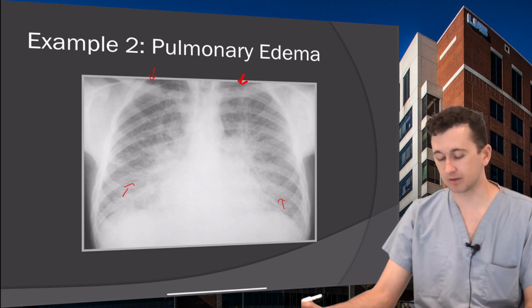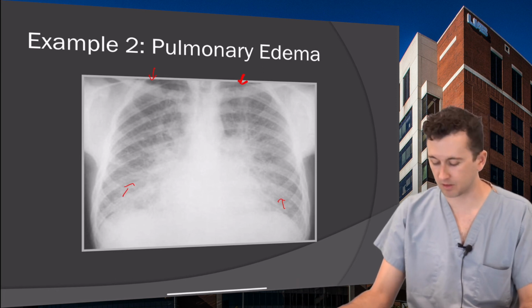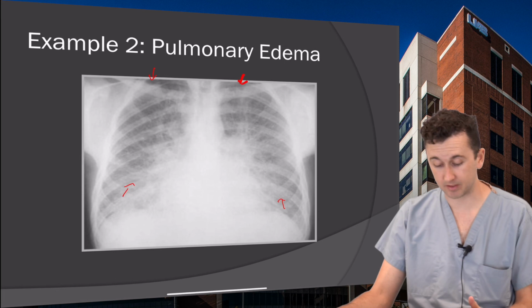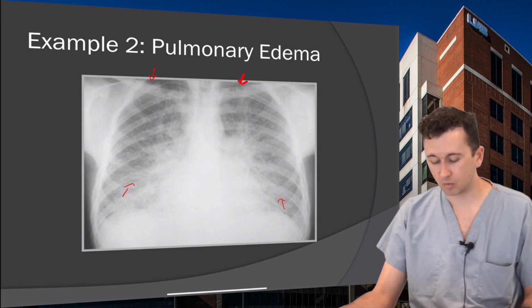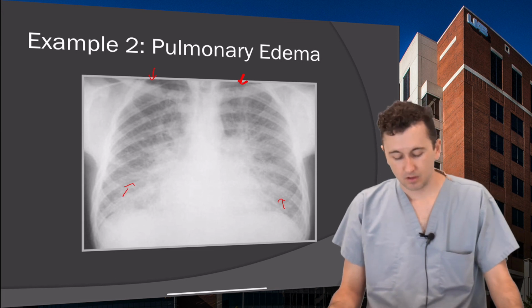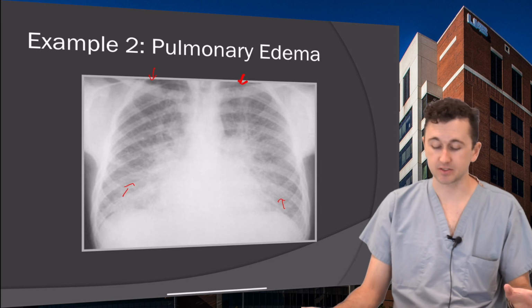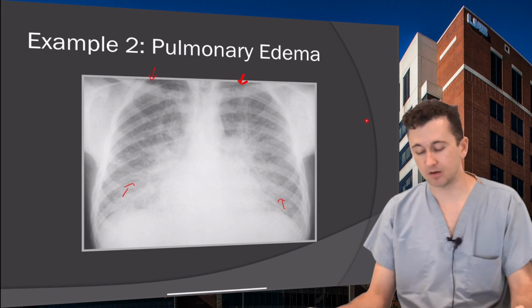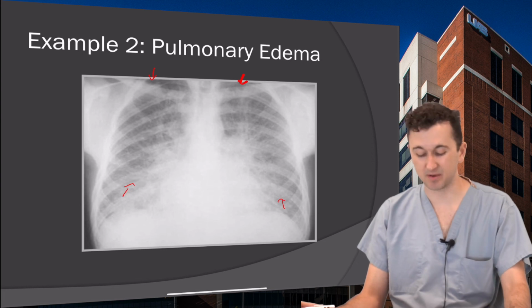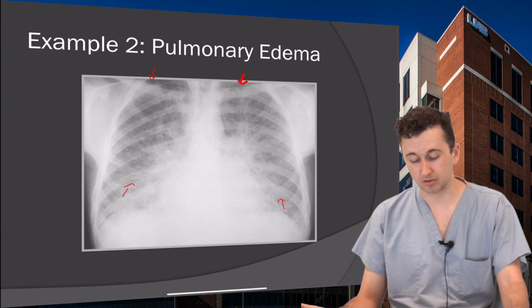Sometimes you do, and generally those patients have really bad heart failure, but a lot of times it'll be clear in the upper parts of the lungs, and that's because it's gravity dependent. And I wanted to point that out because pulmonary edema is often mistaken for pulmonary fibrosis, or I should say it the other way around. Pulmonary fibrosis is often mistaken for pulmonary edema. Pulmonary edema is extremely common. IPF is not that common at all, but they do look similar at first glance.